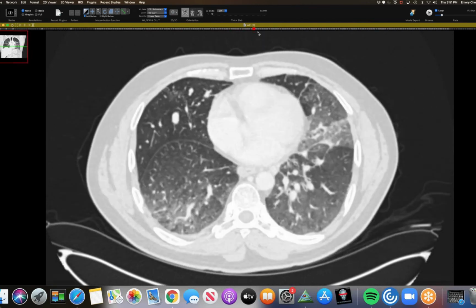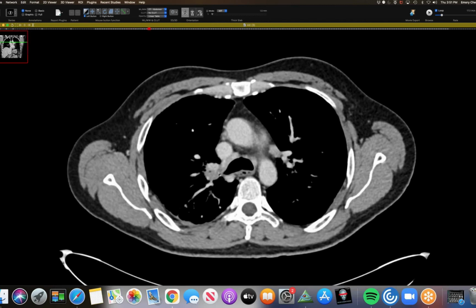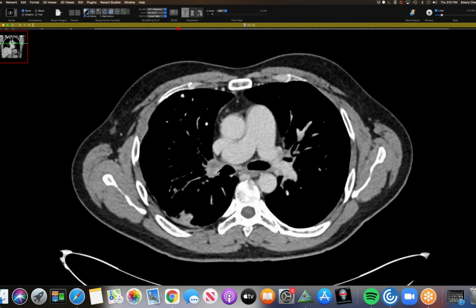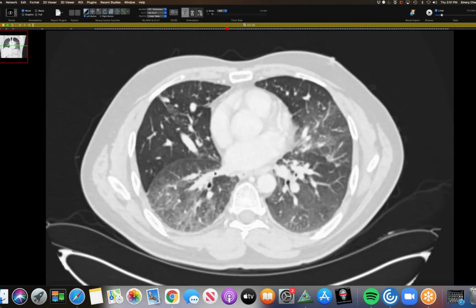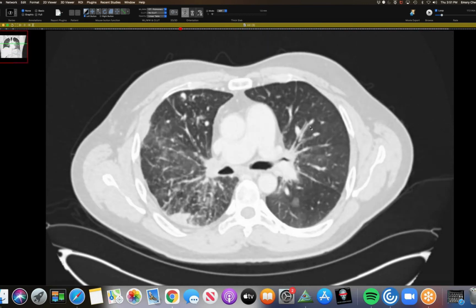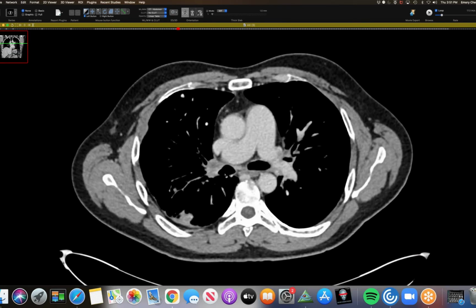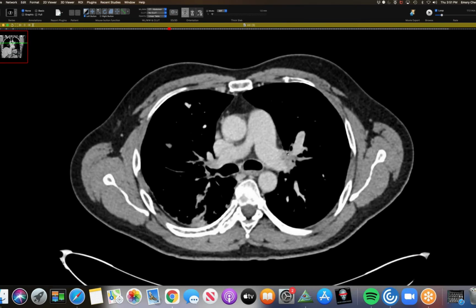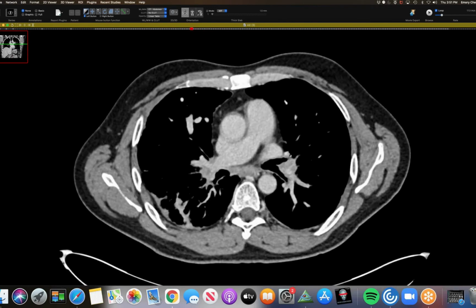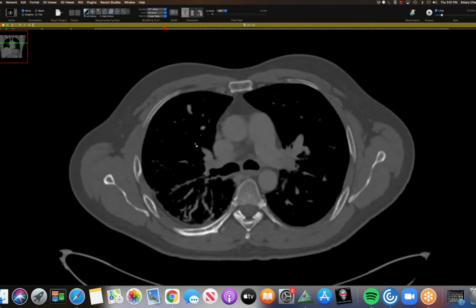But you can see this fibrosis here in his hilum, and the vessels are abnormal. There's venous congestion in different lobes, so some of the veins are occluded. Definitely the left upper vein is occluded here on both sides, I think.